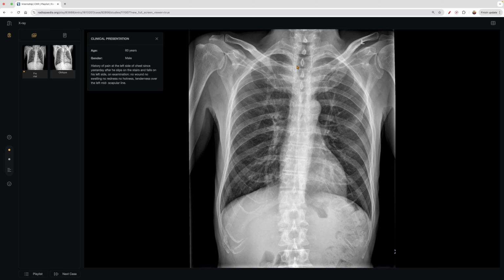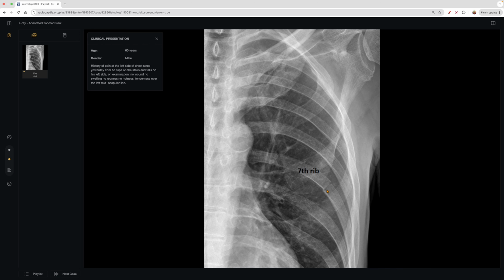In this patient, the key finding was obviously there's a rib fracture, but they also have hyperinflated lungs, and eventually you have an eye for it. This looks more inflated. So 1, 2, 3, 4, 5, 6, 7, 8, 9, 10, 11. So again, you can see that as well. And then they have a history since they fell, right on the left side. Examination, no wound or swelling, but otherwise has that. And let's see. Yeah, they show that too.